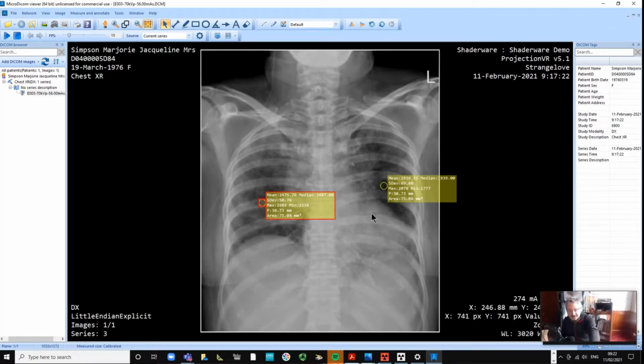Right, do you see what I've done there? So I've got a region of interest, a circle, and what it's doing is it's looking at all the pixel values in that circle. Now I know that the PowerPoint, the lecture that I did on quantum mottle, was sort of essential reading for this, because the idea is that each of those pixel values is slightly variable, even if you're X-raying through something that's very thin, very much the same standard.